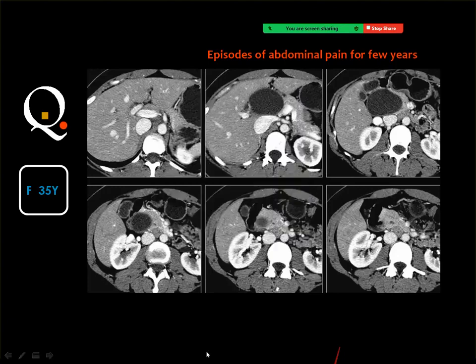You say cystadenoma, doctor? Sorry. Abdominal pain.